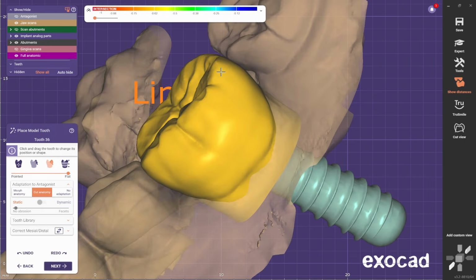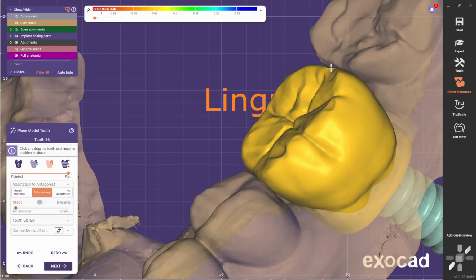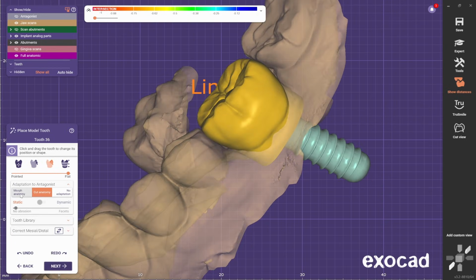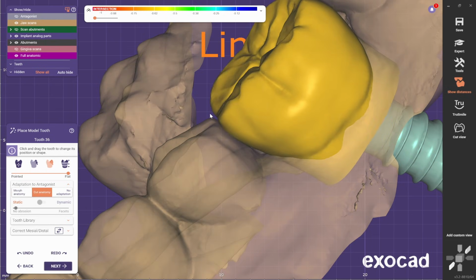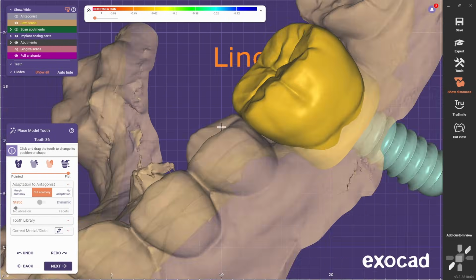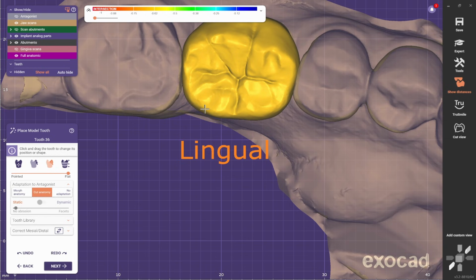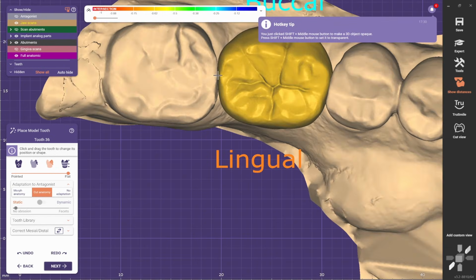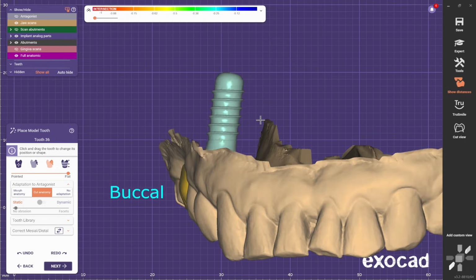Especially in the proximals this tool is much better, because if you use morph anatomy, sometimes it brings all these ridges a bit lower, which is, you see there, and if I try to bring it up, it doesn't allow me, it starts changing the tooth, and I don't like that. So usually I like this tool better. And now we do all the tweaks in this stage. We're gonna smooth a bit the anatomy of the occlusal, just to blend in better, but overall we don't need to do too many changes in the next stage.